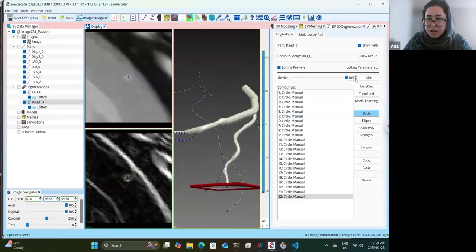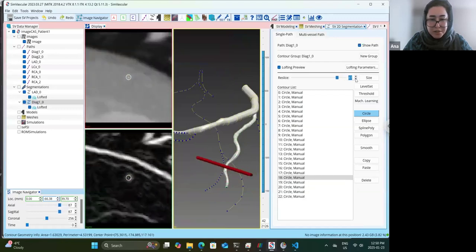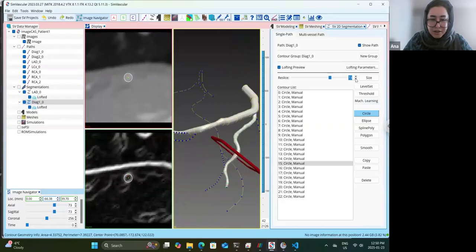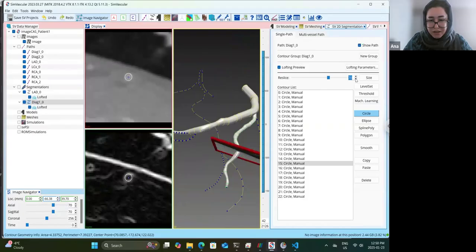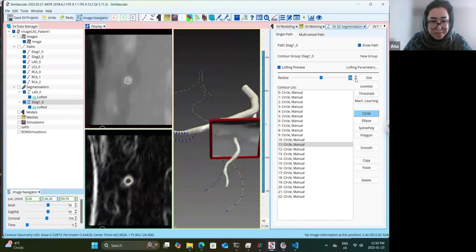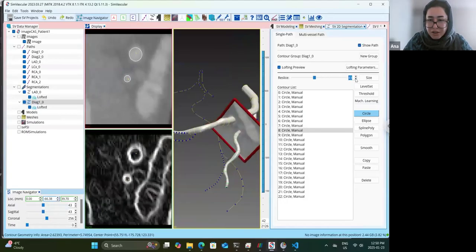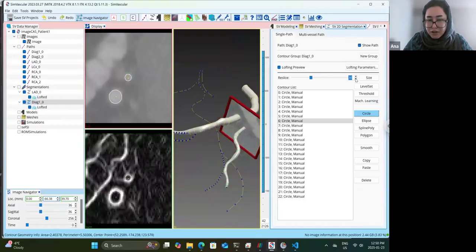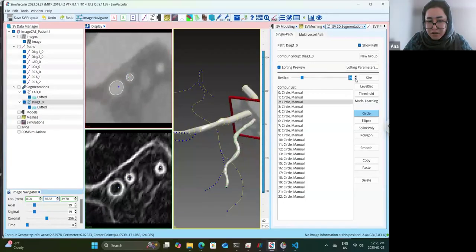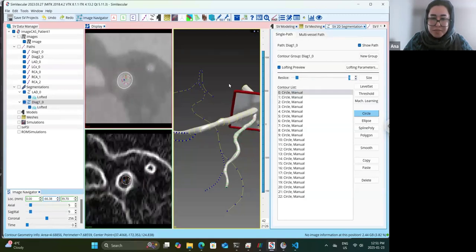It is actually a good idea if you go back through your segmentation, especially in the slices where we didn't do the segmentation, because it fills in between the slices. And sometimes this happens, that the vessel segmentation doesn't match the exact vessel outline. But this was good actually.